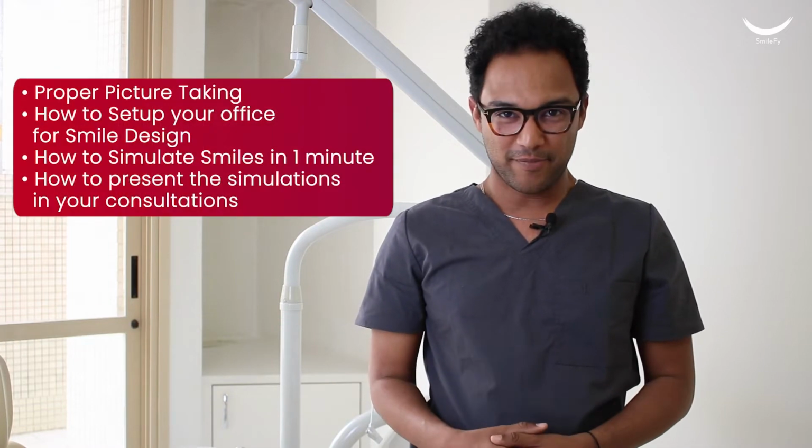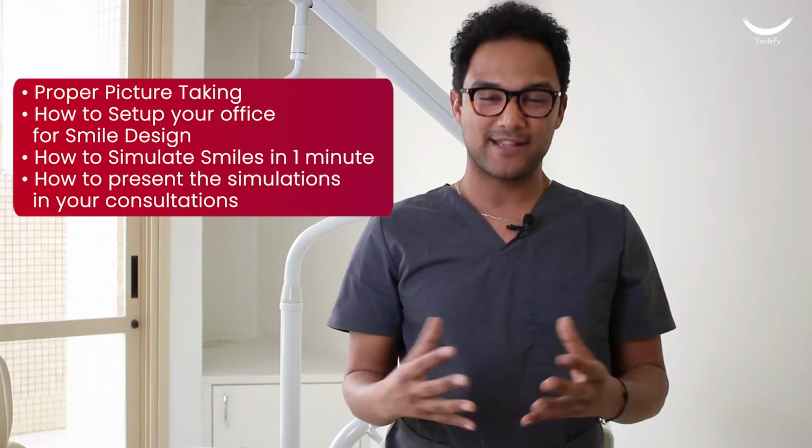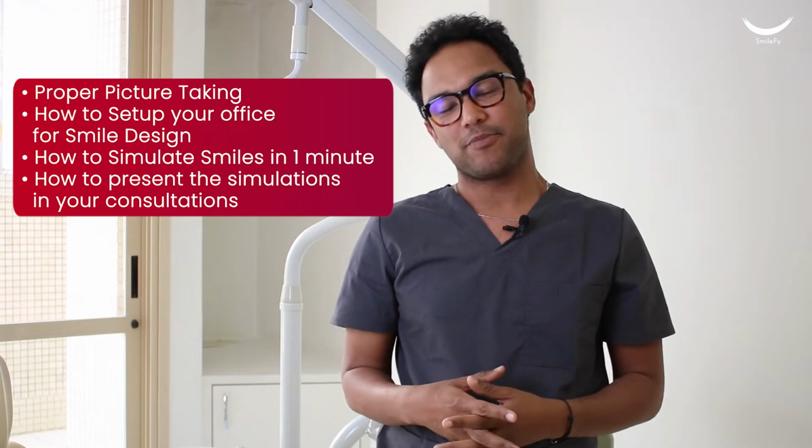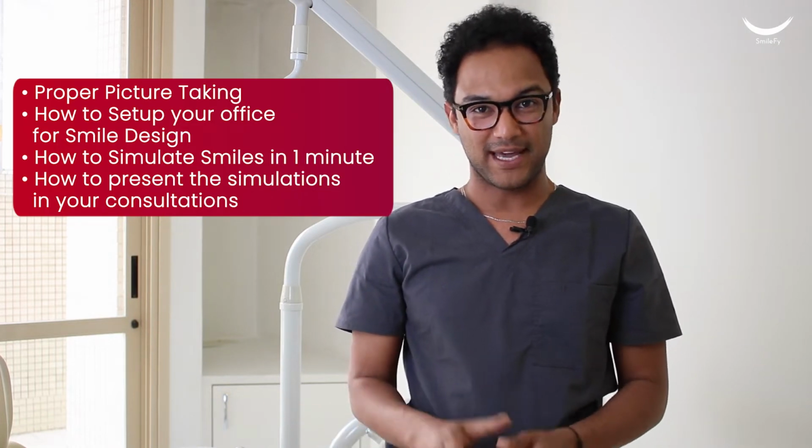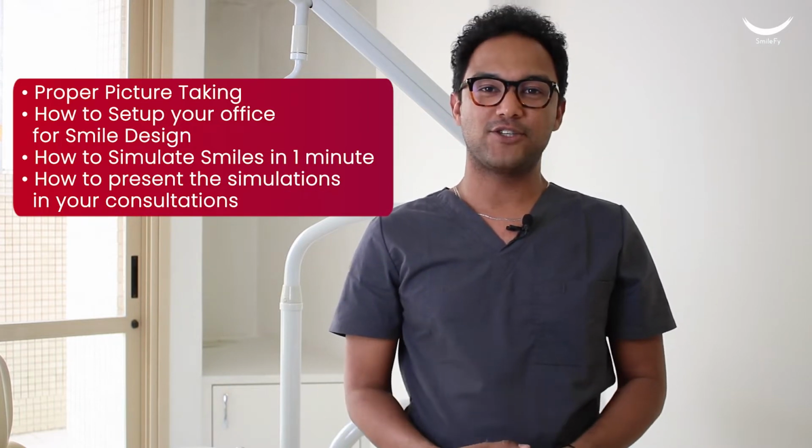Hi, in this video, you learn how to implement smile simulations in your practice. I will teach you how to take the proper picture of a patient, what tools you need to take these pictures, and how to simulate your patient's smiles in just 1 minute using SmileFy software. At the end of the video, you will also be able to present the treatment plan to your patient using this easy-to-use software. So let's get started.